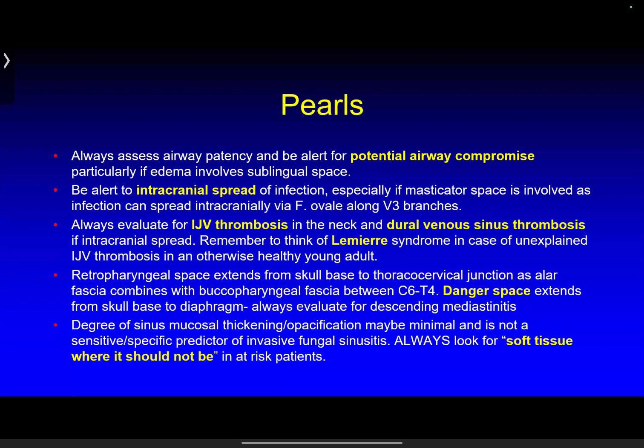You can see retropharyngeal edema as just reactive to a bunch of surrounding things. Any infection in the neck can give you a reactive retropharyngeal edema. You can have reactive retropharyngeal edema with an osteodiscitis, so absolutely it can be there just as a reactive effusion. So it's important to look for rim enhancement because you do not want to drain a retropharyngeal reactive effusion. Only a retropharyngeal abscess needs to be drained.